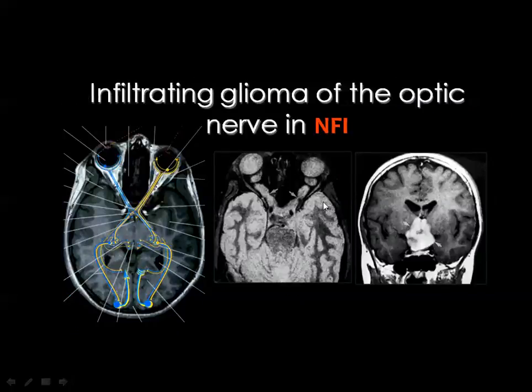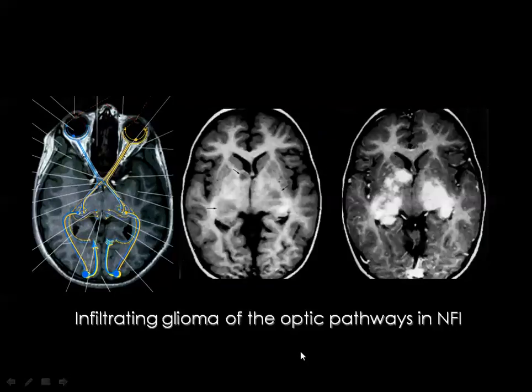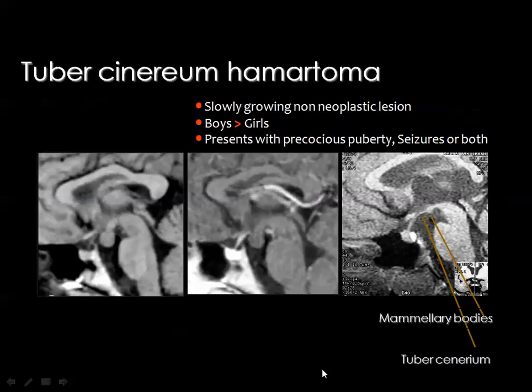And this is an example of bilateral optic nerve glioma. You remember the tortuosity of the optic nerves and the soft tissue masses, and they proceed to the chiasm. In the same case, there is a mass in the suprasellar area showing almost homogeneous post-contrast enhancement, completely separable from the pituitary gland. This is neurofibromatosis type 1 with bilateral optic nerve glioma and hypothalamic glioma as well. And this is another case of neurofibromatosis type 1. The lesions infiltrate the visual pathways and they show low signal in the T1 with post-contrast enhancement, denoting that they are of gliomatous nature.